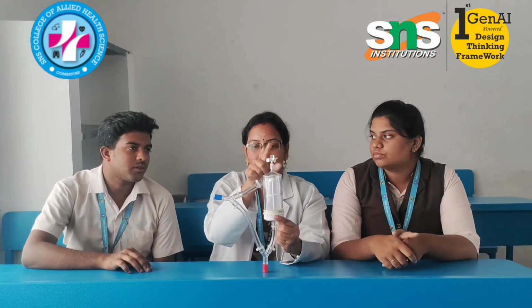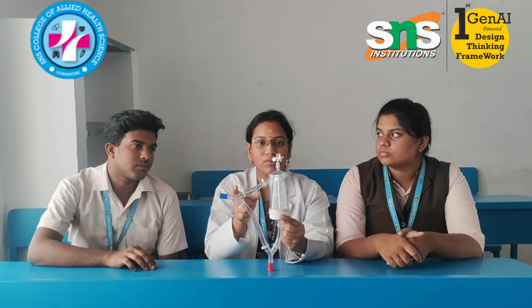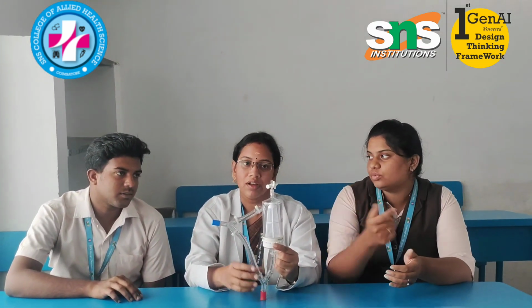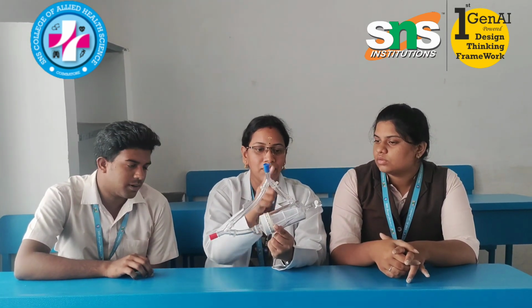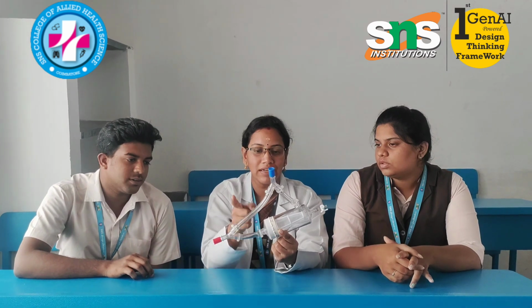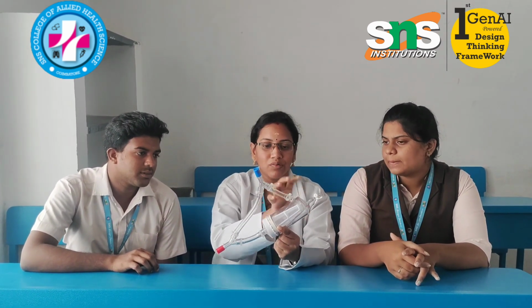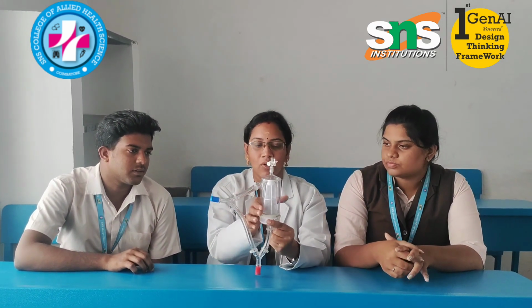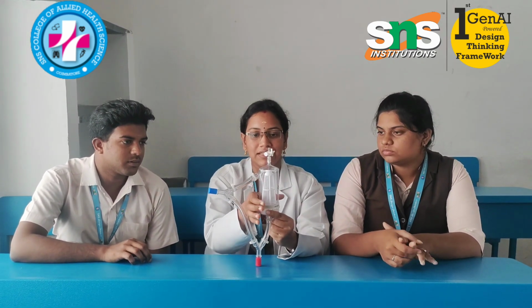The reason for connecting the purge to the low pressure circuit on the reservoir is to avoid the backflow of blood. Backflow of blood is the main reason, and we avoid it through the purge port. So when the pump is turned off for some reason, we have to turn off the purge. You can also tilt the bubble trap to remove the air. Many circuits are tapped, but you cannot tap directly on the bubble trap. You can tap the inlet, outlet and bypass line, so that you remove the air directly from the circuit. Finally, you place the bubble trap on its separate holder.